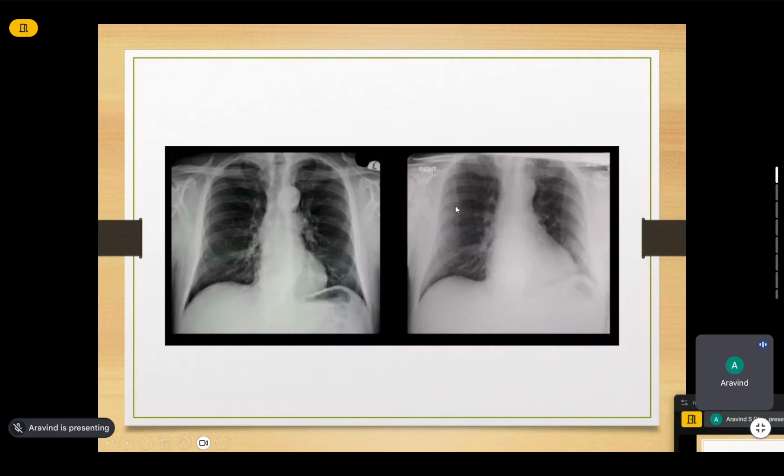And you can also see that the scapula is visible within the lung field. Yes. So this is AP view, and this one is PA view. Here, the scapula is not visible within the lung field, and the clavicle is below the lung apex.